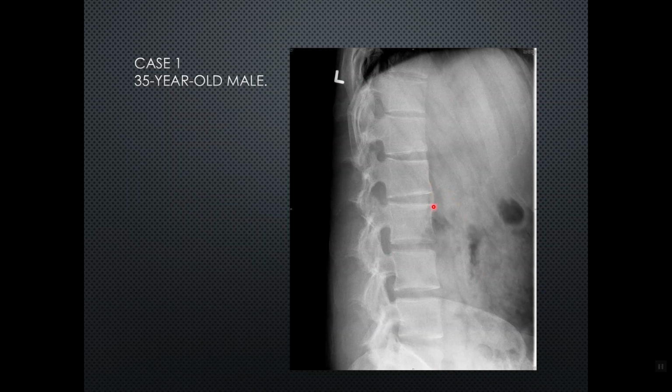What you're actually seeing is a bridging type of syndesmophyte, and it's known as a marginal syndesmophyte. Why? Because it connects the margin to margin of the end plate. In fact, this condition affects the entire end plate, but typically we see it as the ossification, or rather formation, of that bridging marginal syndesmophyte. Now, most likely it is occurring elsewhere, it's just not clearly visualized on X-ray.